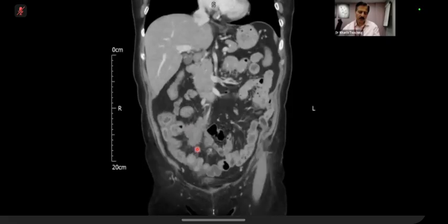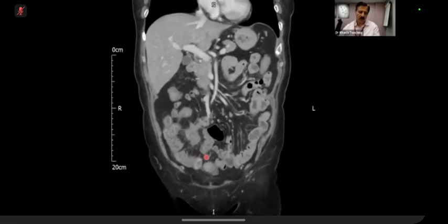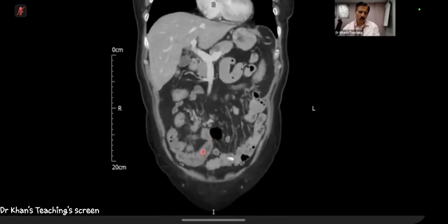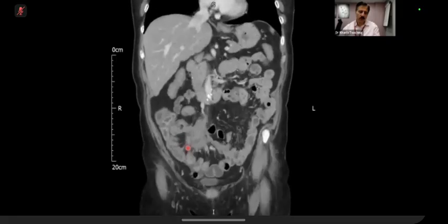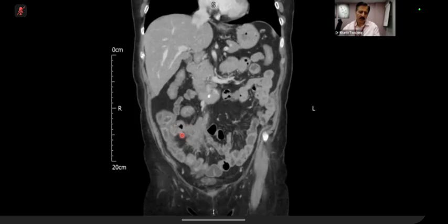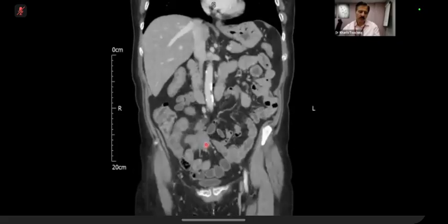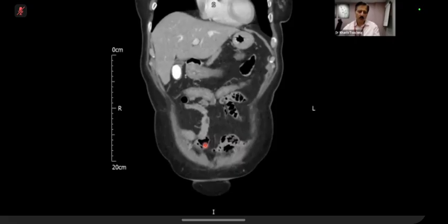This lymphoma is sitting in the mesentery, and you can see how there are striations around it. So you can see that it must be causing a bit of lymphatic or venous obstruction. And with that, you can see the adjacent bowel loops here, and why it will cause mucosal thickening. Here, look at this loop, there is a bit of thickening of this loop. So anything which is sitting in the mesentery, particularly lymphoma, also carcinoid, can cause these kinds of abnormalities.